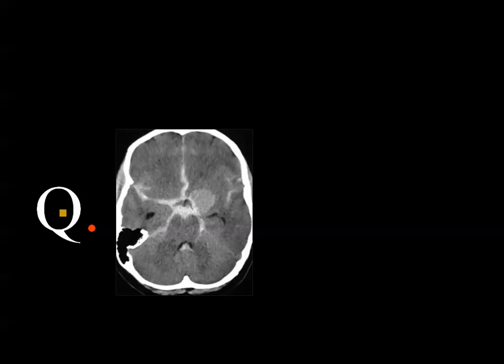Minimal description, please. Without contrast. Yeah. Without contrast.